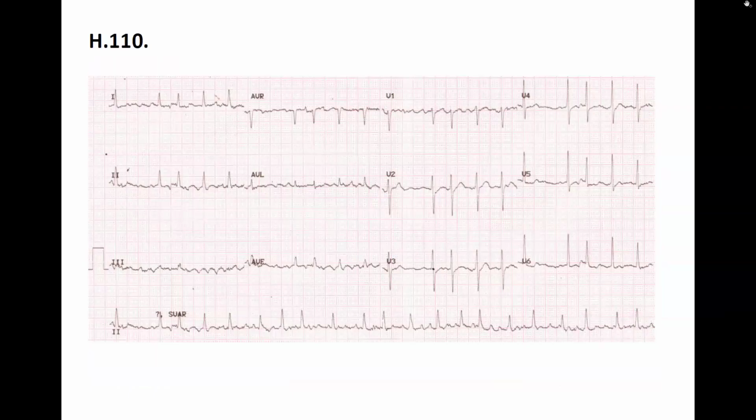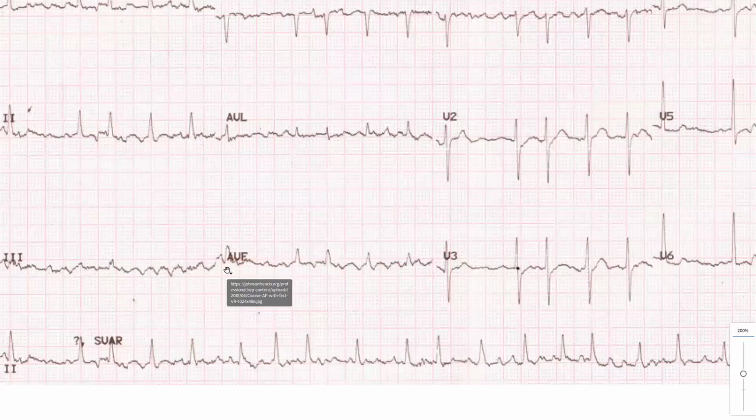Okay. So right off the bat, I don't think it is rhythmic. I'm going to enlarge it a little bit for you. So it's not rhythmic for sure.